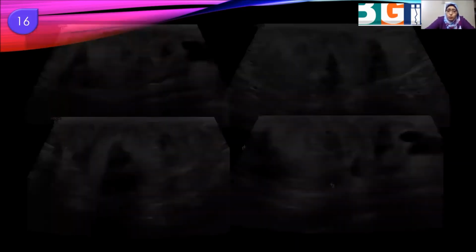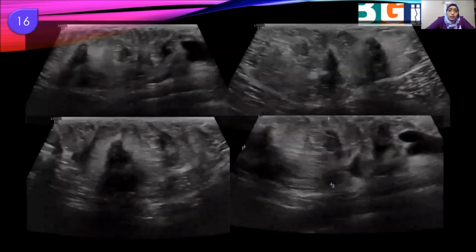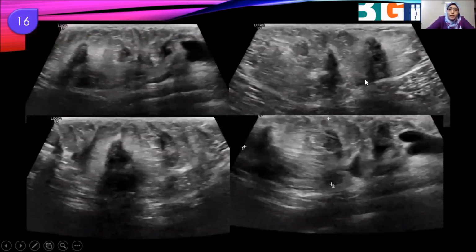So we brought the patient again for a second look ultrasound. We found the actual size of the lesion, not the preliminary one, with this internal shadowing, which I think was calcific foci. And what we assumed to be suspicious lesions were actually all inside this large lesion.